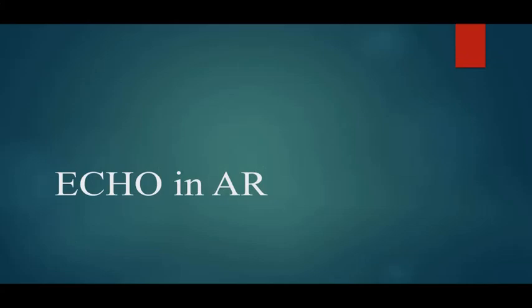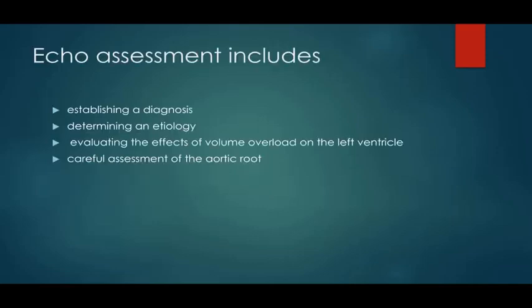Echocardiography in aortic regurgitation. In today's class, we will be discussing transthoracic echocardiography in aortic regurgitation. Echo assessment includes establishing a diagnosis, determining an etiology, evaluating the effects of volume overload on the left ventricle, and careful assessment of the aortic root.